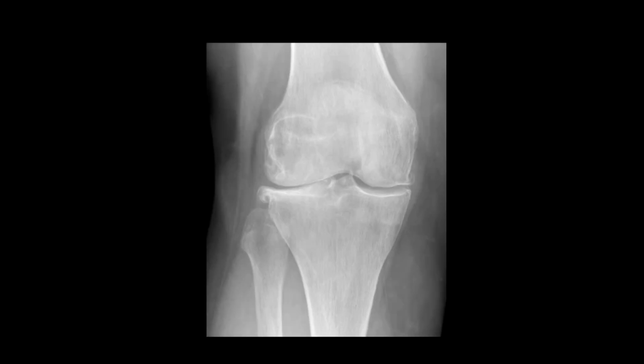Now here's our first x-ray to review. Again, I want you to use the ABS system that we've gone over. Pause the video, have a look, and then we'll review it in a moment. So hopefully you've had a chance to look at this x-ray. Again, we're going to look at the alignment. We can see that our femoral epicondyles are within 5 millimeters vertically of our tibial condyles. And now when we move on to look at the joint space, hopefully it should be clear that our joint space over here is very narrow. Our tibial spines are effectively in contact with our femur over here.